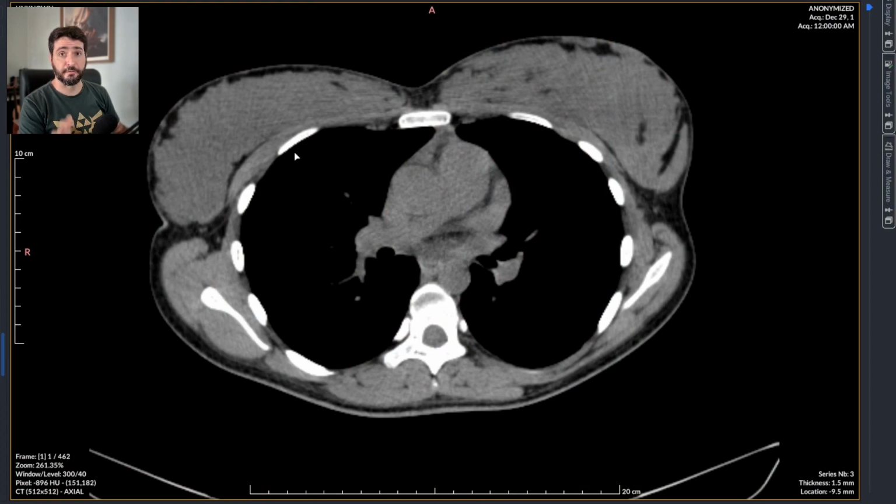So this is a young female, a CT scan of the abdomen, and we are looking for a palpable mass on the pelvis, an acute painful abdomen related to a mass, a lower abdomen, a pelvic mass.